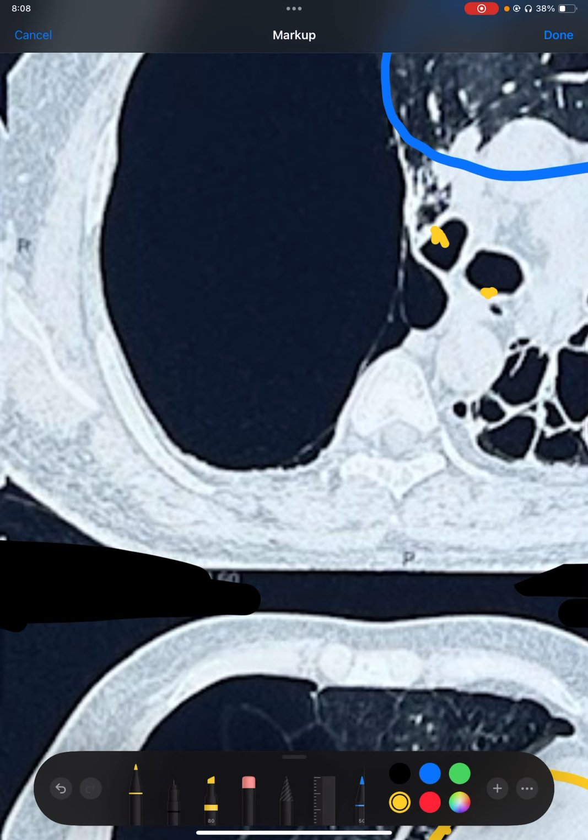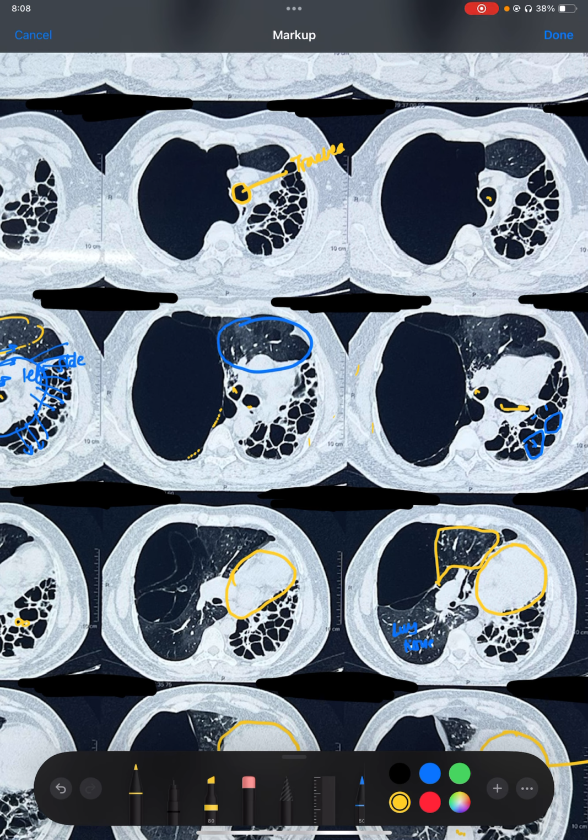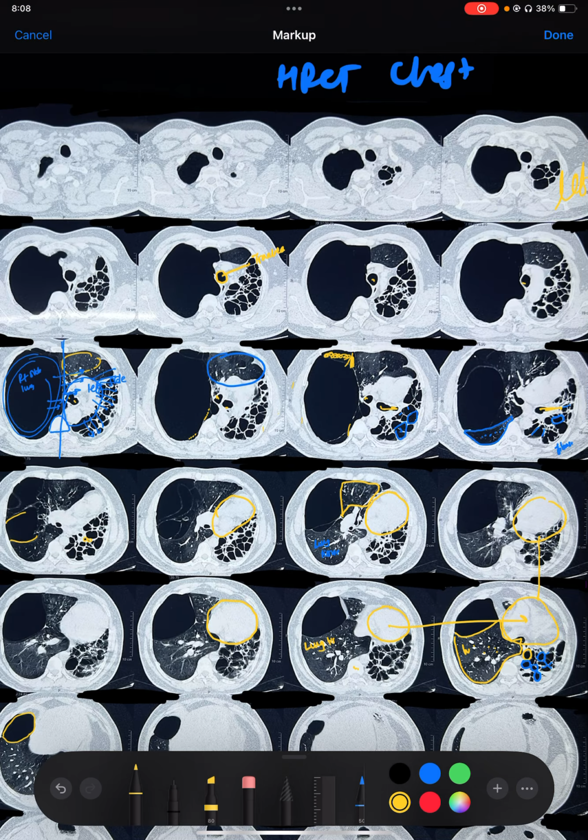We can very clearly see the lung margin is there. So if this would have been pneumothorax, it should not have spared this lung also. It should have completely displaced this lung also to cause complete collapse of this right-sided lung.